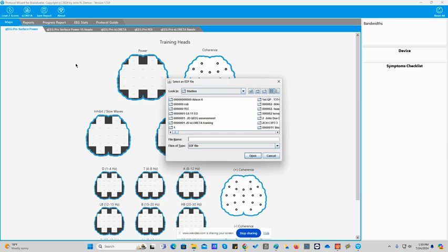Once we open up the PW editor, we have access to the BrainAvatar Studies folder. We'll be looking at two different cases. First, let's open up Rob, and there is Rob's eyes closed EDF file. This is a full QEEG recording that has not been edited and cannot be used to create accurate brain maps, but we're going to edit it right now.